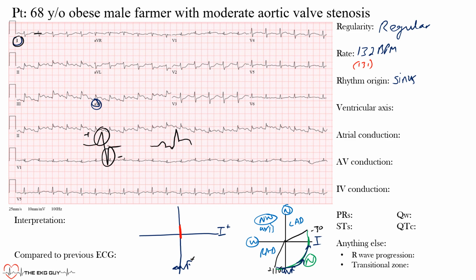So we're looking at this, mostly that's a small negative, but most of this is positive, okay? So in other words, we would go towards the positive end of AVF, okay? So towards the positive end, which would mean that our axis lies somewhere here, okay?